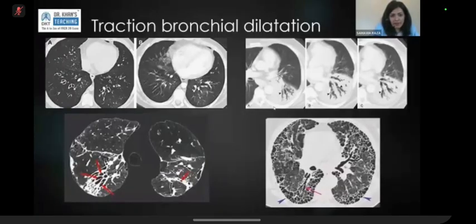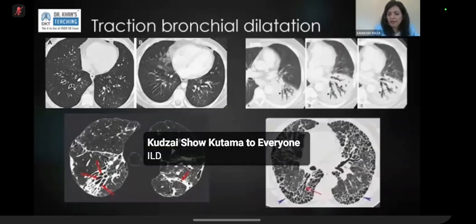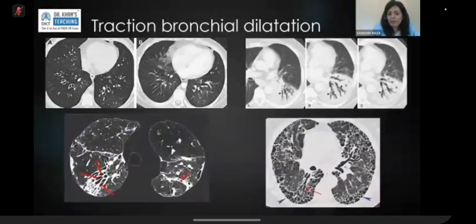Neda has said air bronchogram in context of consolidation, and that's absolutely right. This is consolidation. So this is the point I was trying to make. Sometimes you can see dilated bronchi in consolidation as well, and that presence of air bronchogram can immediately make you think, is this bronchus dilated or is this ILD? This appearance is a bit more prominent than you would see in normal consolidation.